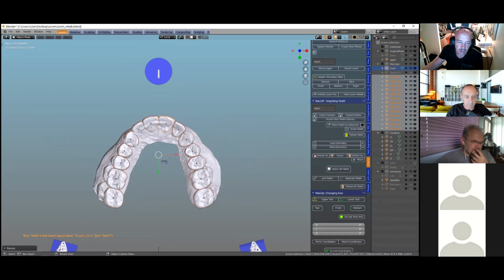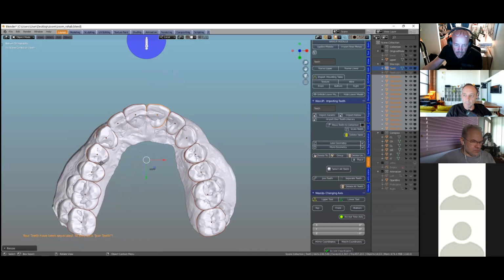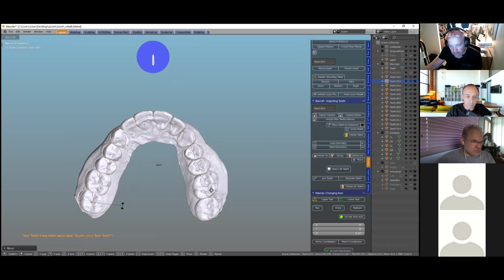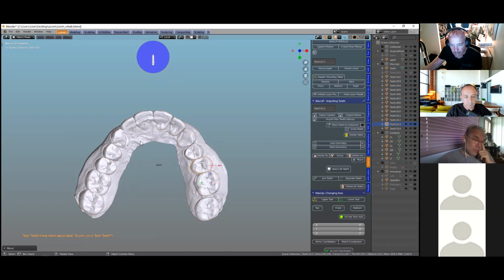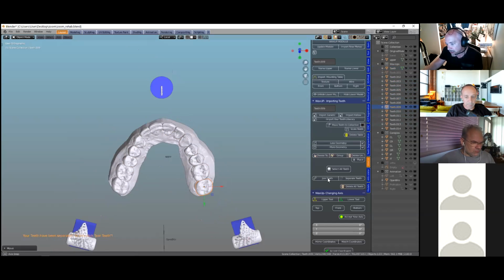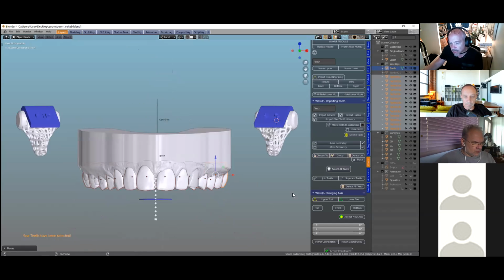I'm constantly using the separate, because we're working individually. Let's put this one over here, something like that. And I'm going to join them again. Select teeth and join them again.